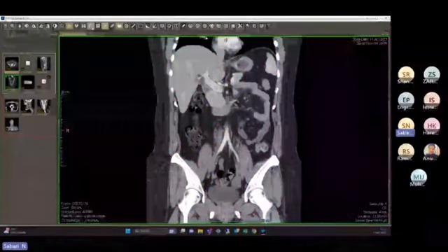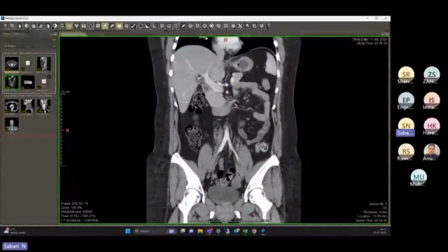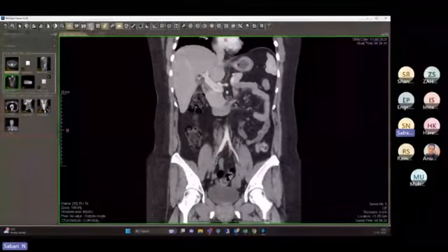So whatever changes you made, when you click on the reset button, it will go back to normal. It will not get stored on the server. It will not do anything. So you can do anything. You can play around with these images, whatever you want to click. Finally, when you click reset, it will automatically move back.